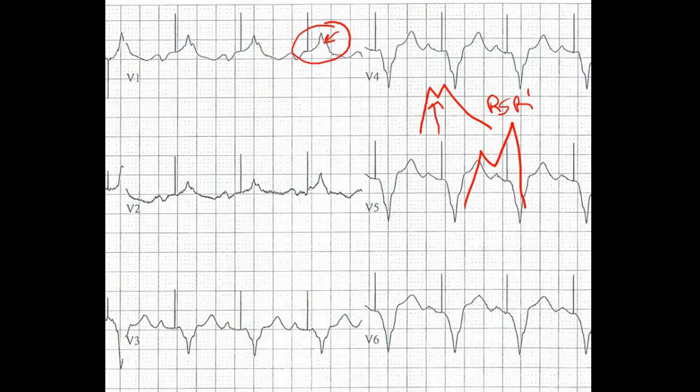And by taking advantage of that, I can now look for the most obvious sign of a J point, and that obvious sign is right here. This is a pretty convincing J point, that part. And we have it here as well. So then what I do is I draw a line from what I think is a J point and take a look at all the others.